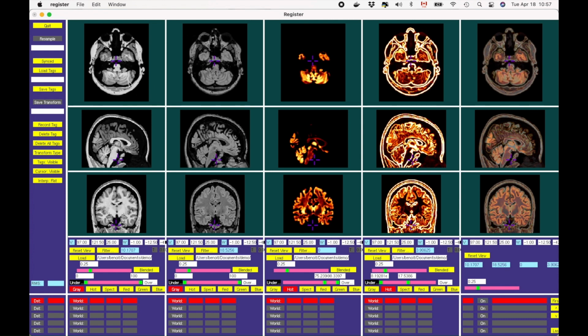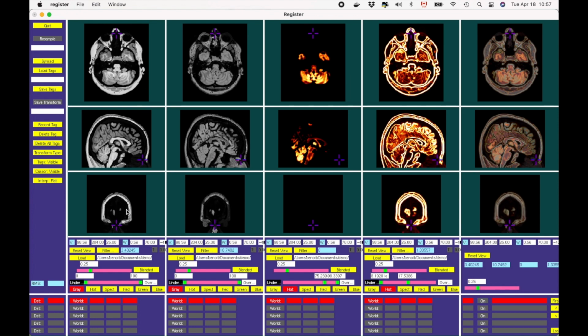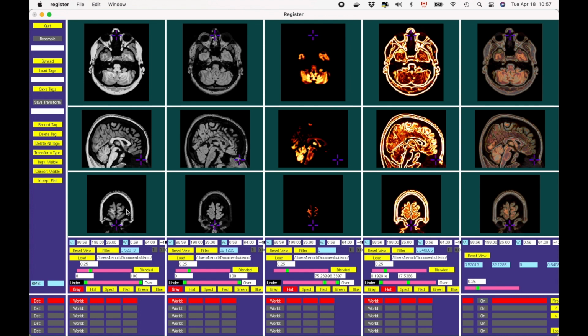and I can move to the coronal view, starting with the anterior part of the head. And again, I move slowly, slice by slice, looking for the FCD signs, which I repeat are a lower gradient and a higher relative intensity.